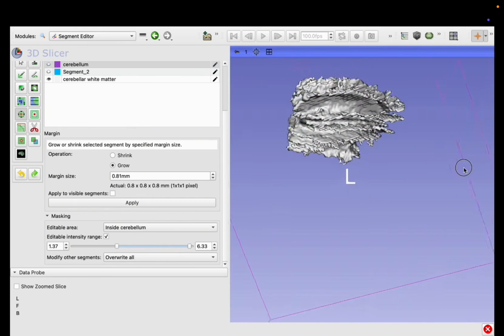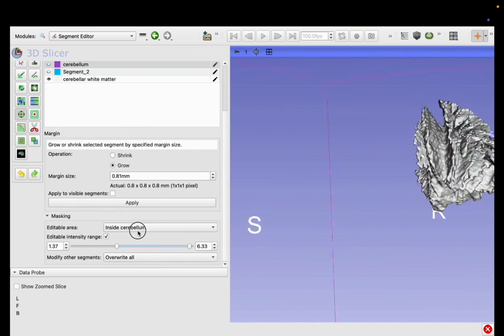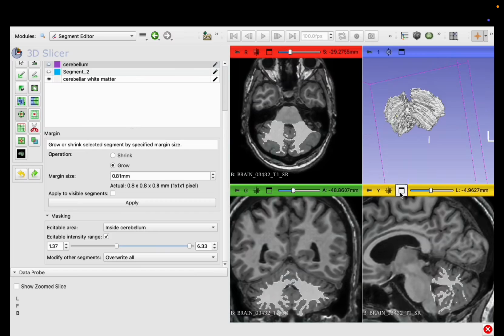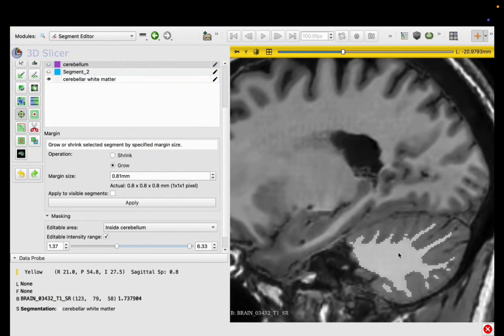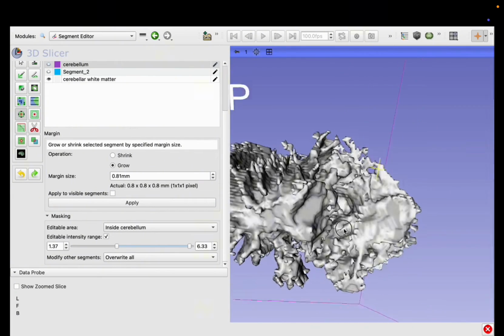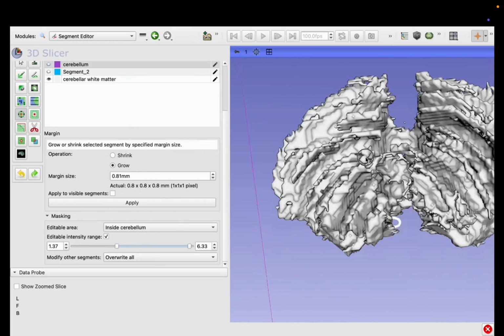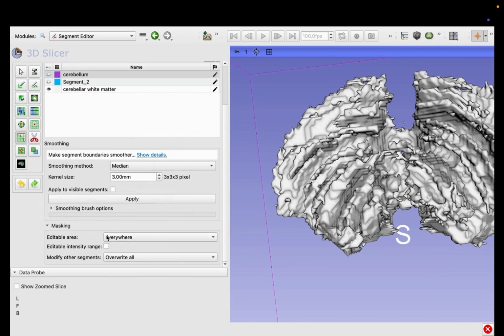And this is the 3D structure that has been created. As with all the 3D structures that we create, this one also needs some corrections. Use the smoothing tool and also the islands tool to smooth the structure and remove the extra islands. If you see any inconsistency with the real structure, you can use the paint tool for micro under or over segmentations in your structure. It is based on the accuracy of the previous stages.